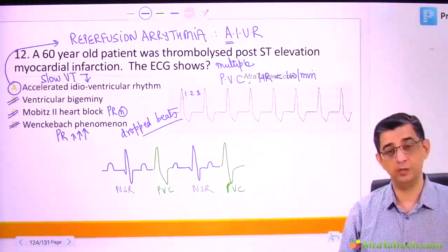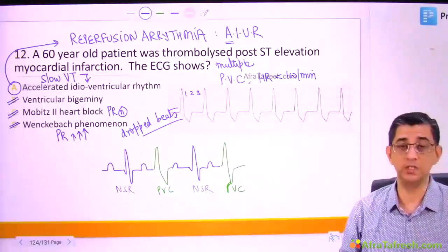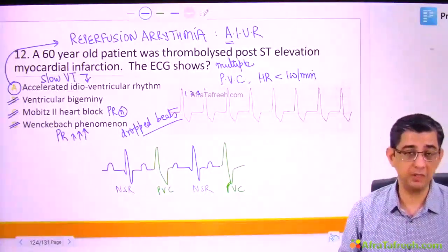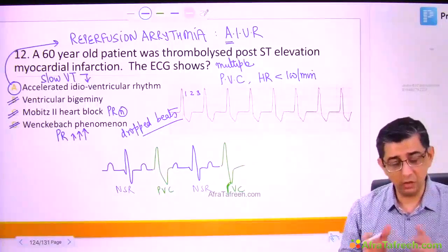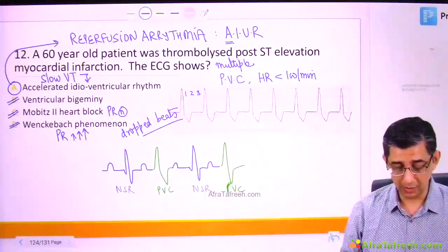Broad complex and narrow complex tachycardia is always asked in any entrance exam. Whether you want to sit for USMLE, PLAB, or any routine PG entrance exam in India, or any screening exam, you'll always notice questions coming on narrow complex and wide complex. So this exercise should definitely be a benefit to you.